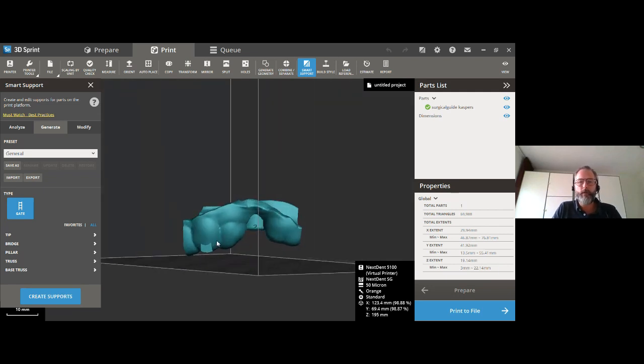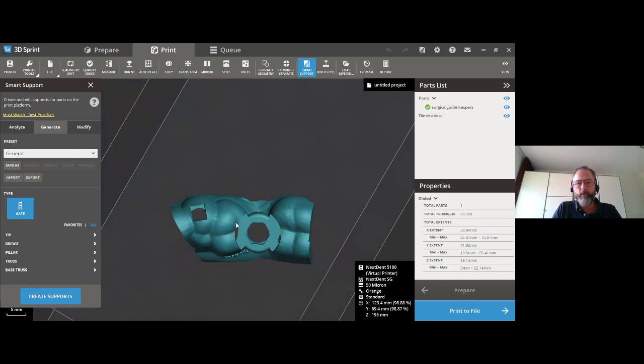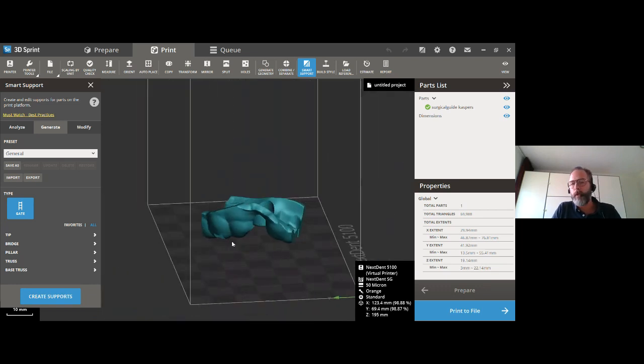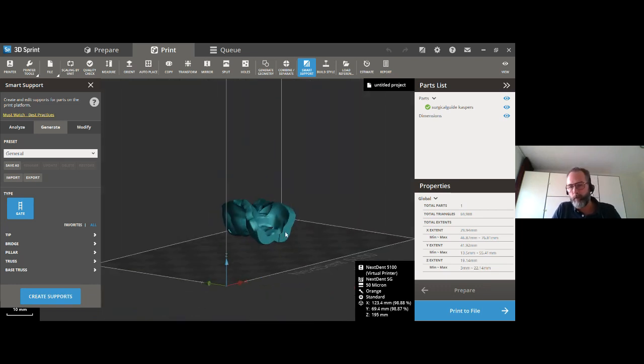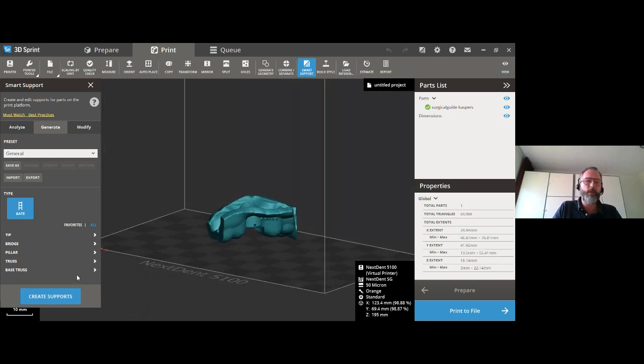For instance, here we had the surgical guide. We had a support style that was creating supports which worked, but they were quite thick. And sometimes small pieces broke off from the printed part. We went back to the software guys and also the printing engineers and said, look, is there something we can change? And they said, yes, we can look into this.